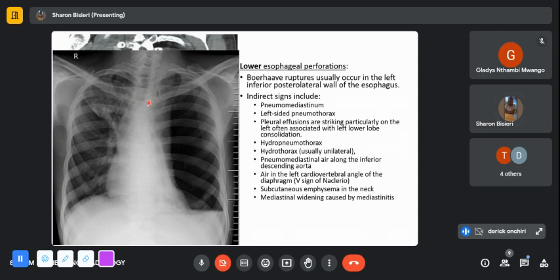So maybe I would ask Doc for guidance at this point. How can you quantify the significance of a rotation in a chest X-ray so that it doesn't impact our pathology interpretation? Thank you.